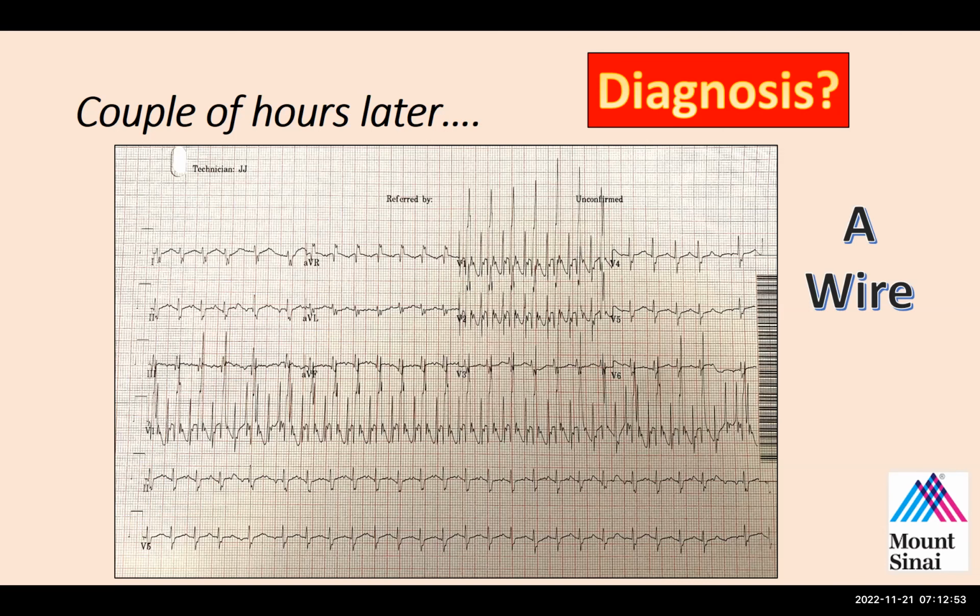No, because I only see one atrial depolarization and then ventricular depolarization, except, oh wait. Let's see. So I see 1, 2.